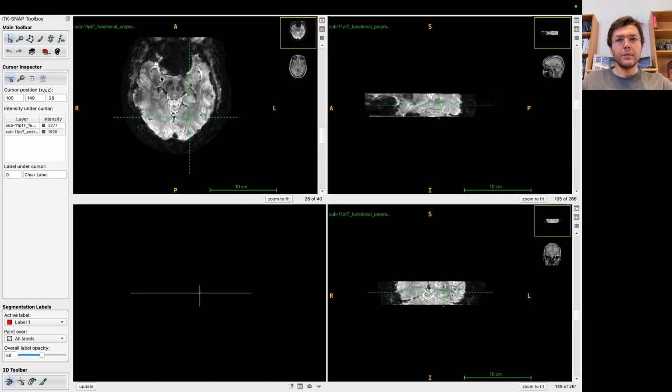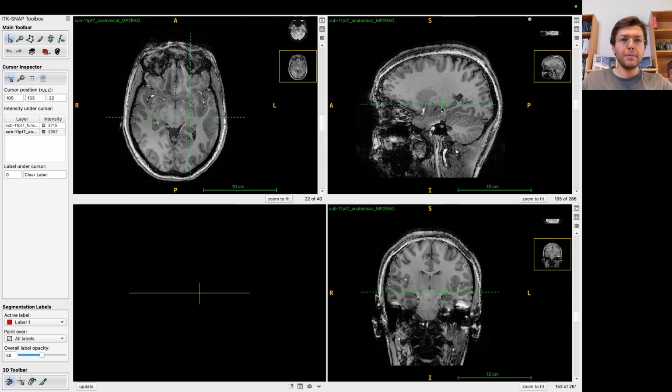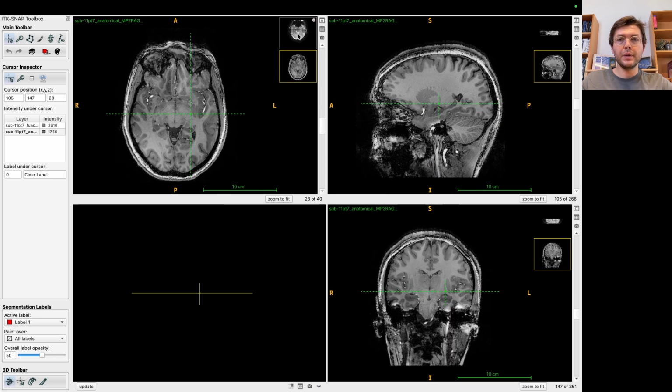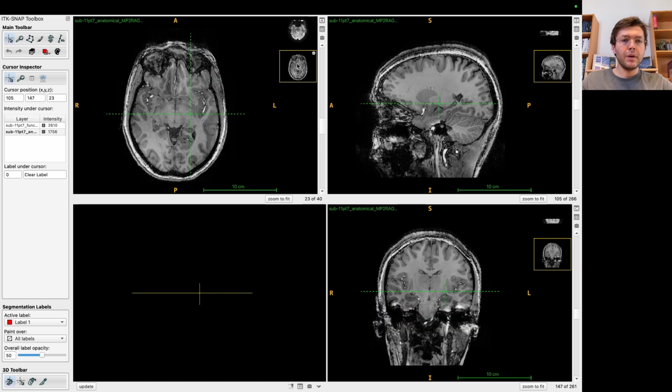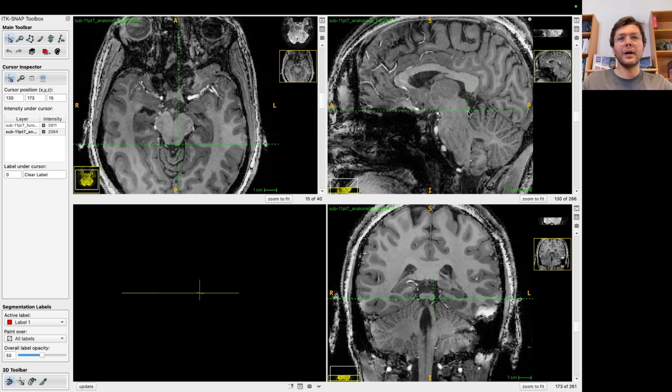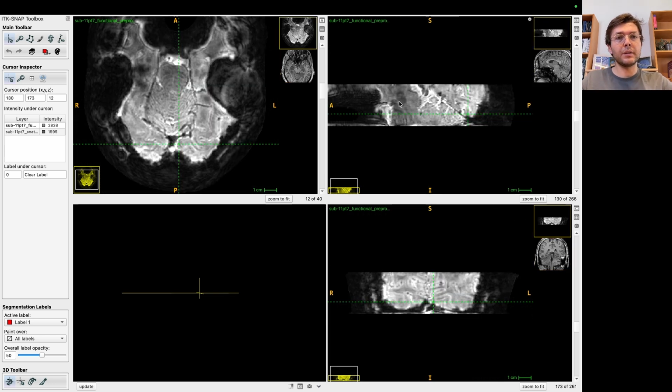Okay. So here it seems that they are more or less in the same planes, but obviously far away from a good registration. So how can we proceed with it? I know that Alejandro already ran some automatic algorithms and they failed. So I'm not even going to try the things that he already tried, but I'm going to show him a sure way of getting things right.